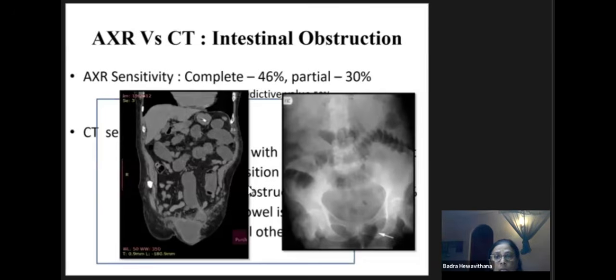So then we did the CT scan because we could not find the cause in a hurry. So what happened was there was this strangulated inguinal hernia. But later on, when we looked at it, it was there actually even on the X-ray. So the vigilance is very important. But as you see, you may think that you don't see the cause, but this is a rare instance. Don't think that you can see all these things in the X-ray. So very often we quickly do the CT scan. So this is a non-contrast CT that shows the obstruction and the cause of obstruction.